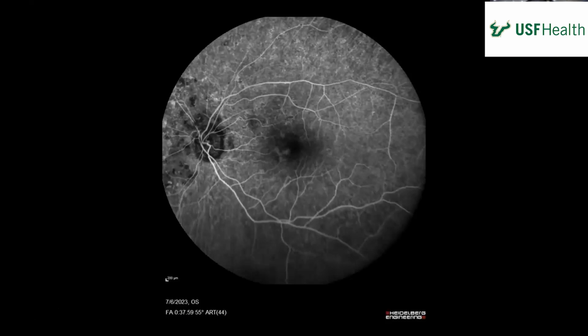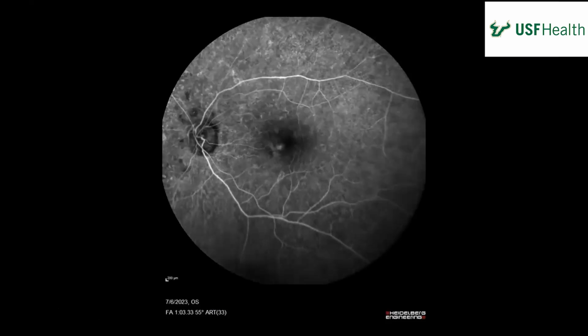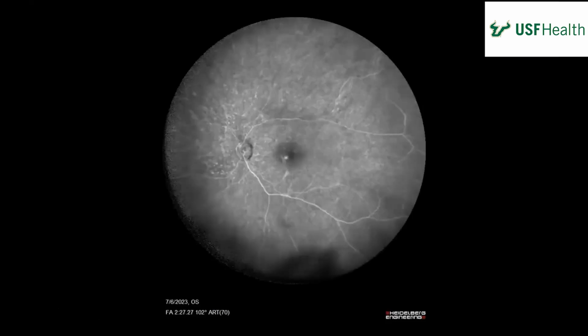That's kind of weird, right? There's nasal area, it's beaten up. The outer retina is beaten up. Okay, good. Yeah, and then areas of leakage over here, like you said, and the macula as well, the vessel attenuation, and then usually the delay between the choroidal filling and the arterial filling should be like a second or so. Here it's several seconds, so likely there's narrowing of the central retinal artery.